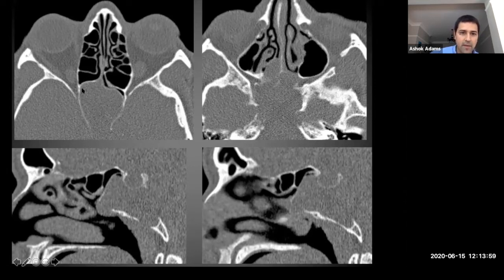So you can see here, opacified sphenoid. You can't really make out whether it's right or left. Probably you can see there's some remodeling there, so that's probably on the left side, the left sphenoid sinus drainage pathway. And then if you reformat this onto the sagittal plane, you can see that the bony margins, particularly on the posterior aspect of the clivus, are not clearly defined.